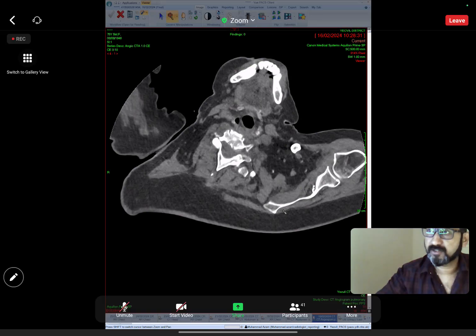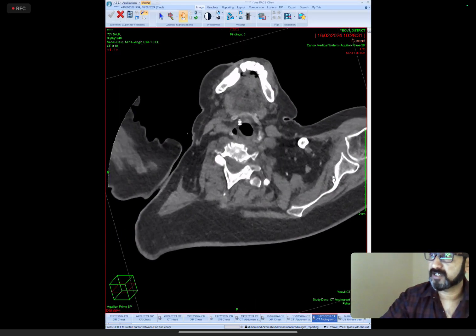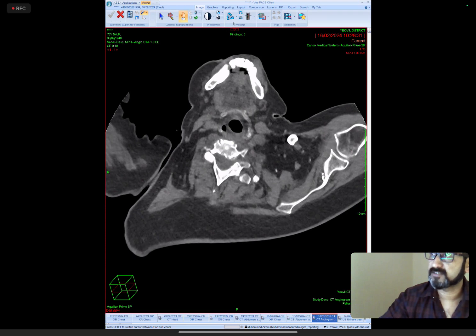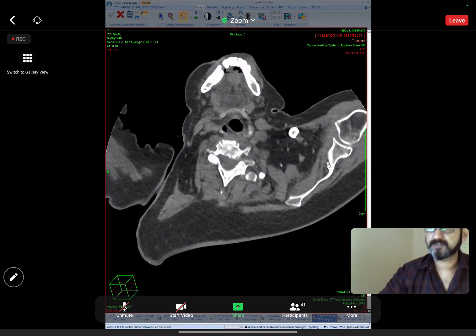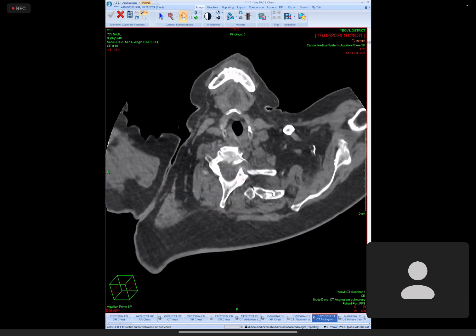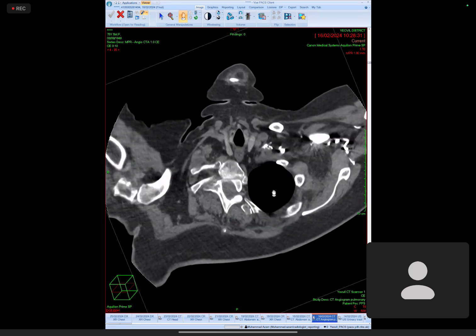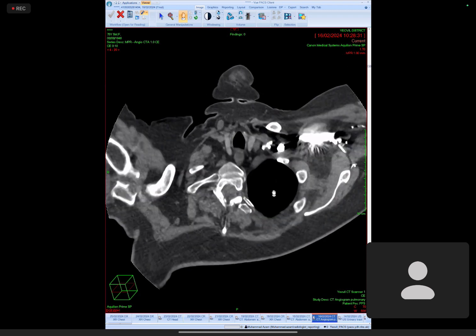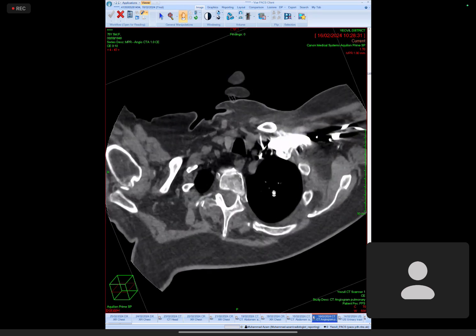Okay, this is a patient, a 75-year-old female who has presented with dyspnea and desaturating. So, this is your last case, please. Yes, sir. You said dyspnea, and I'm presented with the CT scan axial slices of a 75-year-old female who has presented with shortness of breath, dyspnea, and she's desaturating.